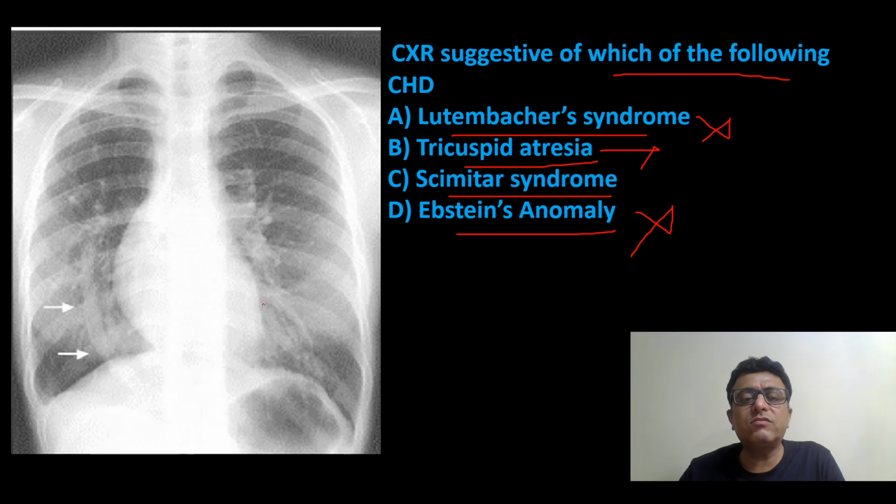So what things are we seeing in this? The heart is shifted a little bit towards the right side. You can notice this point. This point is very important, and the arrow is indicating it.